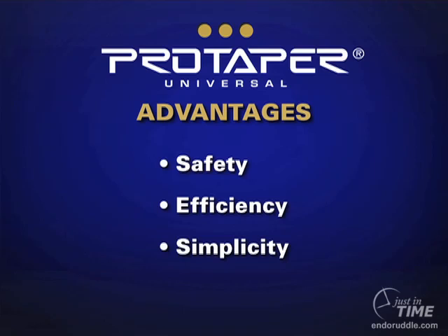There are many advantages to the ProTaper files, but first of all, anytime you change the taper on a single file, it improves the safety of the instrument. In fact, it makes the instrument safer than all similar sized instruments, because fixed tapered instruments tend to be a little bit more grabby, but by changing the taper, you have a very small engagement zone and instruments don't tend to screw, and breakage has been shown in different Journal of Endodontics articles to be lower in a changing tapered instrument.